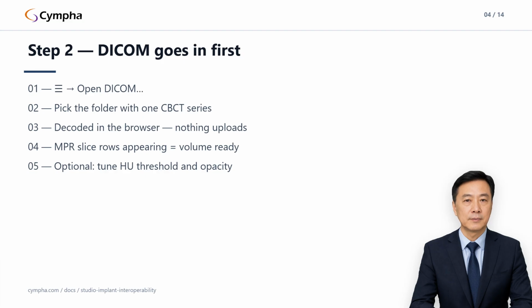Now the project. Hamburger menu, open implant project, the file picker is restricted to the project format, and pick the colleague's file. What happens next depends entirely on the UID match. If it matches, everything unfolds at once: the implants load, the model's browser opens automatically, and the implant tools toolbox in the left strip expands so the parameter panel and the design log are visible.